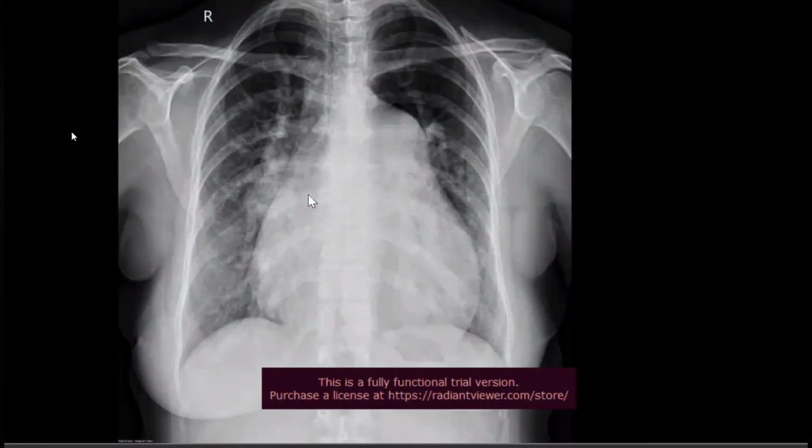This is a chest X-ray of a mature skeleton, frontal projection, showing there is cardiomegaly along with dilatation of the pulmonary artery, while the aortic knuckle appears normal, and the CP angle appears acute, and there is increased vascularity in the upper lobes, representing plethora of vessels.